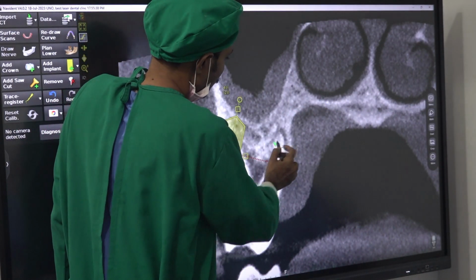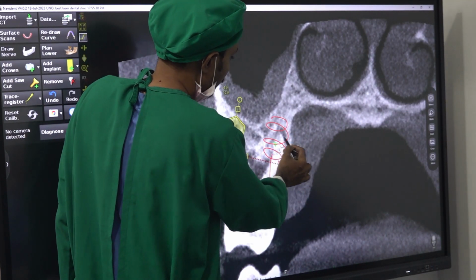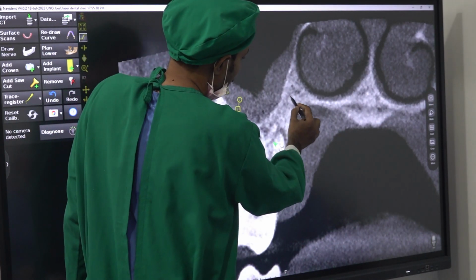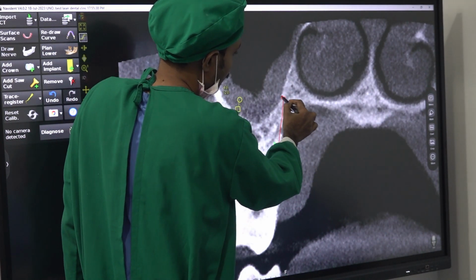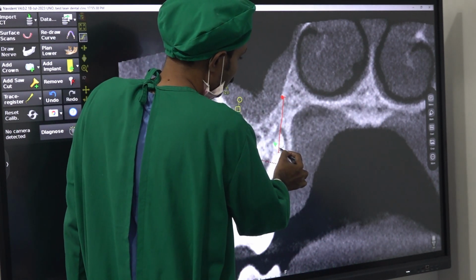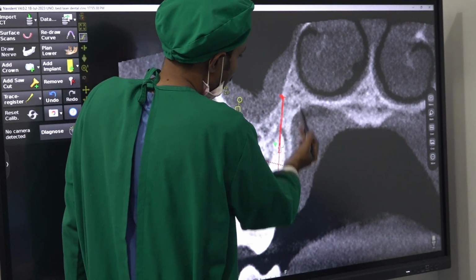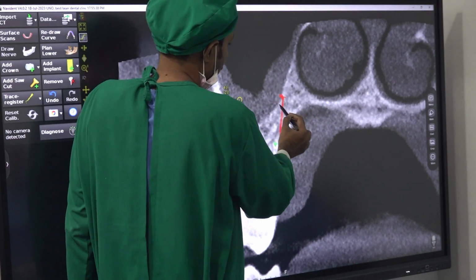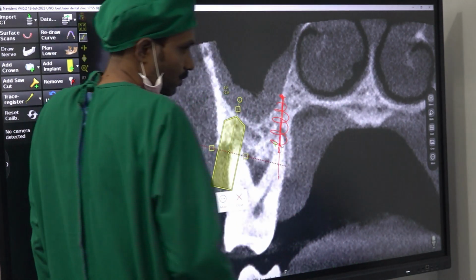One, you can place a 5.5 basal implant. It will get support from here and here. And one more option is you can place an implant till here, beyond the apex, wherever you are feeling the drop. Not necessarily the nasal floor or sinus floor, because if you go through the apex, you will go here only. Go from here to here, see what length is available, feel the drop, and you can select a BCS basal design 3.3. Okay, or even a compressive implant.